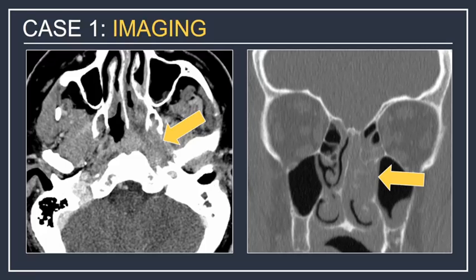Now, because the patient had persistent symptoms of left mastoid and middle ear effusions, our attention then goes to the left nasopharynx to look for a potential obstructing lesion. And here on these soft tissue windows, we can see that there's asymmetric soft tissue thickening within that left nasopharynx. We can also see some additional findings within the left nasal cavity. There's complete opacification within the left sinonasal cavity.